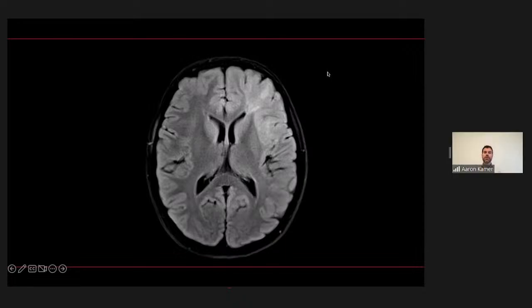Okay, and how would you describe this in some of the terms that I just was using in talking about this abnormality that's epileptogenic? Yeah, so I guess maybe some cortical thickening, perhaps, and I don't know if this is like the transmantle sign you were describing. Yep, absolutely. So we're starting to think about a type 2 cortical dysplasia here. Nicely done. All right.